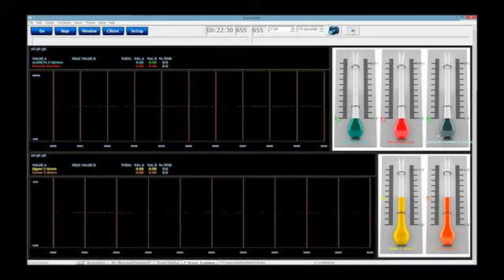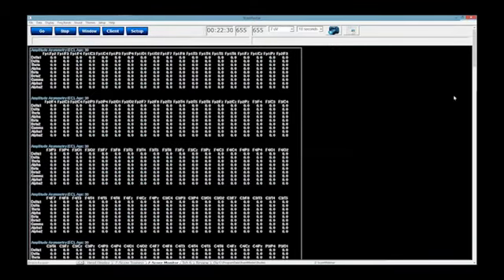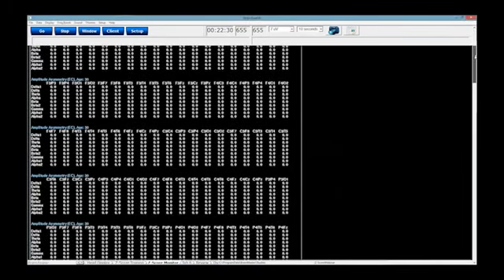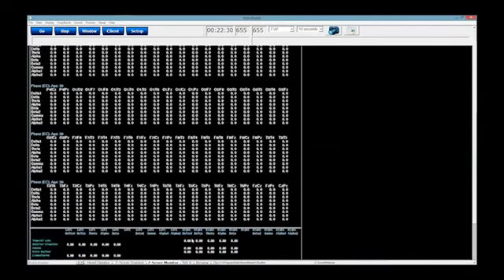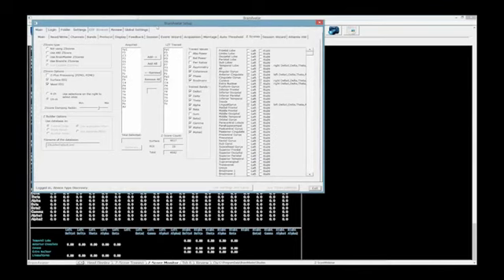Except you're going to notice one extra little bit, one little extra thermometer. And you're going to notice on our ZScore Monitor page, you're going to have a whole lot of different things. Not only are you going to have all of those, but you're going to have additional regions of interest. So I'm going to hit Control Z, which is going to bring up my menu.